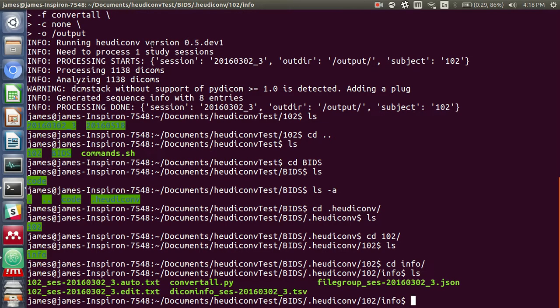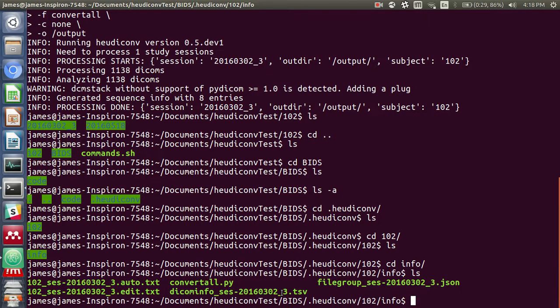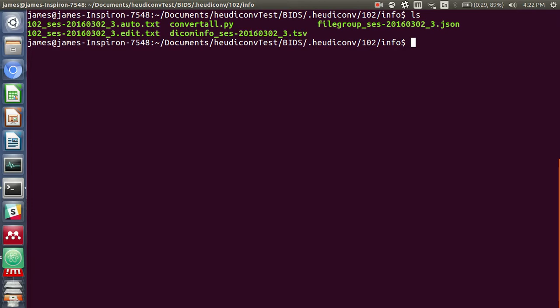I'm actually going to pause the video here to make sure that we don't see any potentially revealing information about the subject in the Heudiconv info file. So I'm going to hurry up and delete some of that information. Alright, and we're back. And all the information should have been cleared, so we should be good to open up some files.